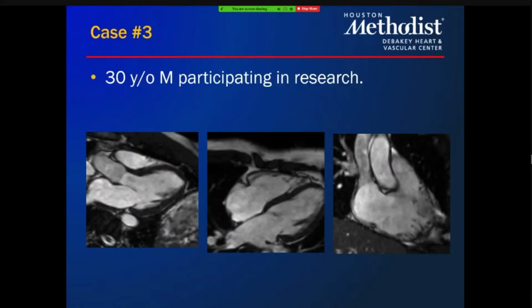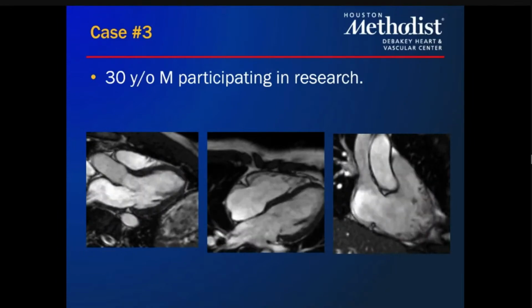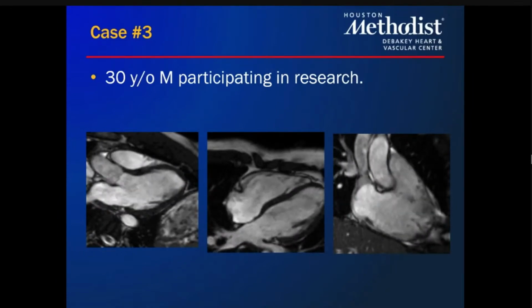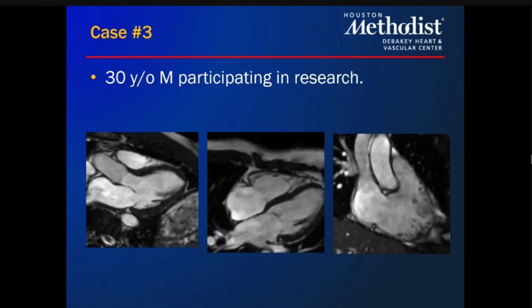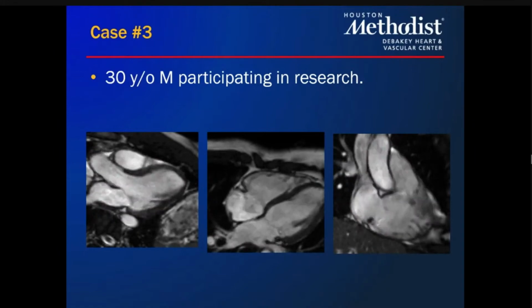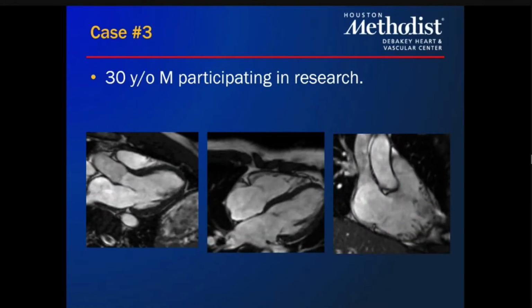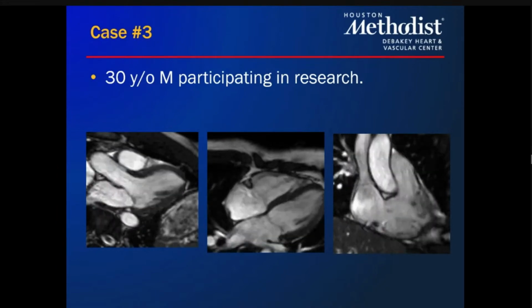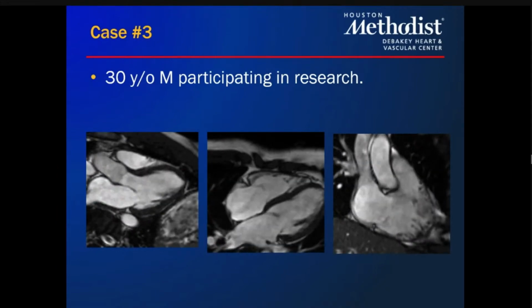Now moving on, this is another common indication for sending patients to CMR. So this is a 30-year-old former fellow of ours who decided to volunteer for research. Any of the fellows want to comment on what they see, what they think?